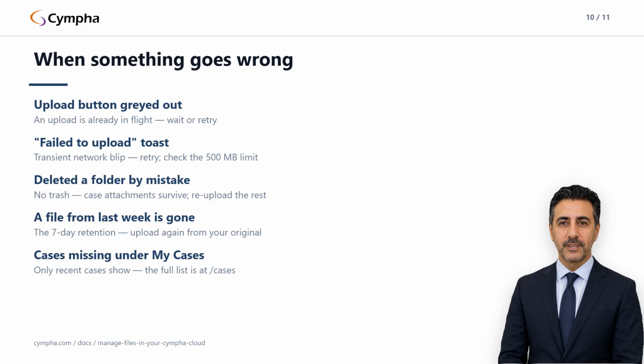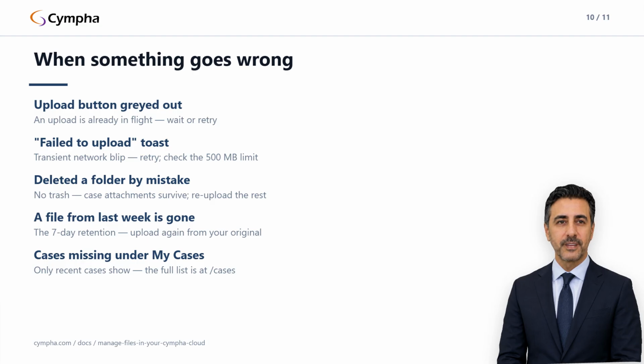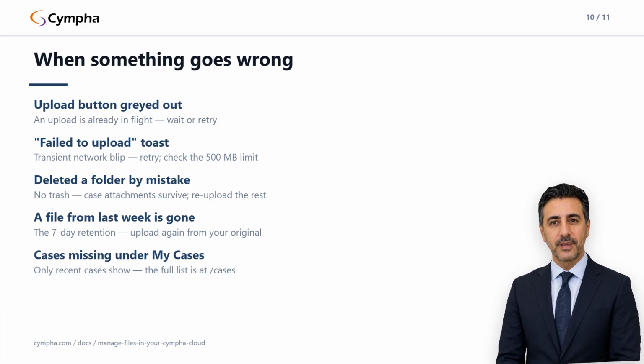If a file you uploaded last week is gone, that's the 7-day retention doing exactly what it does. Upload again from your local original. And if a case isn't showing under My Cases, remember that section only shows recent cases. Older ones are still on a regular cases list.